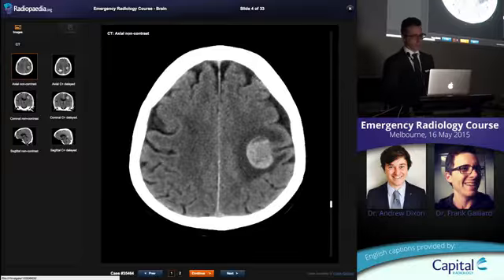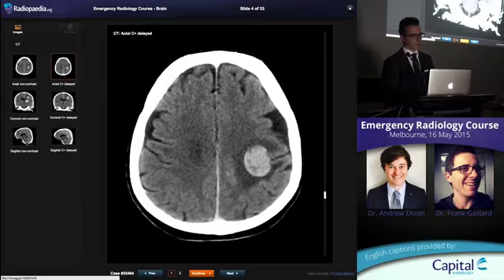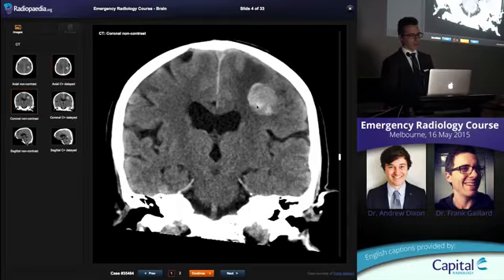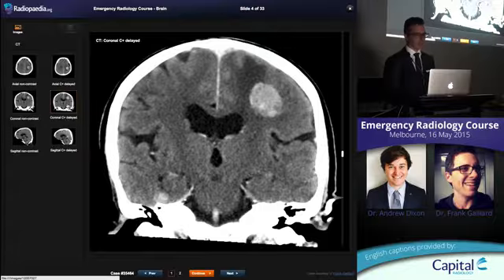And if you give contrast, you kind of have to flick backwards and forwards. But look at this superior component here on pre-contrast and post-contrast. Okay, so this is a hemorrhagic lesion that is enhancing. The whole lesion is hemorrhagic. It's just interspersed in amongst viable tumour. And this is fairly characteristic of a handful of lesions.